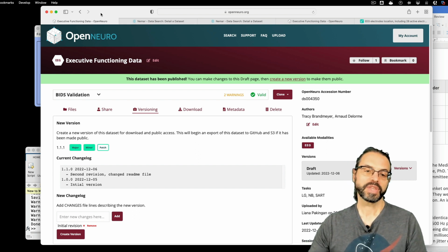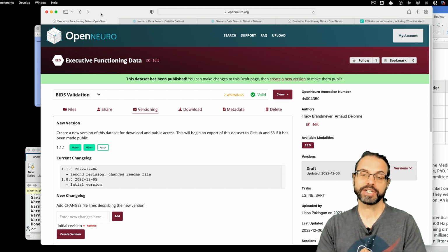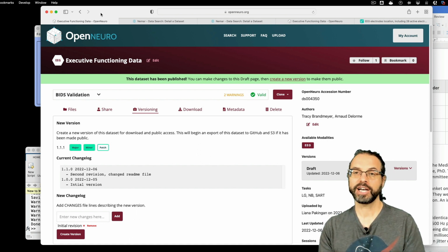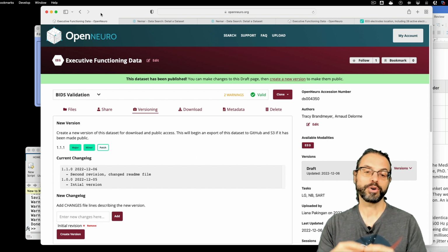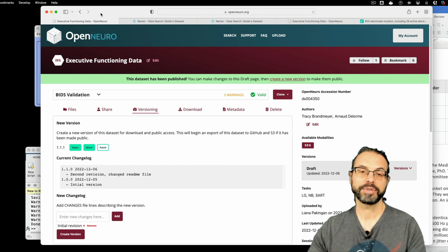So you can do it like this, and it's going to take you just a couple of minutes to export your data. But of course, that's not the recommended method. Even if you have a very detailed description in the paper of all the events, it's actually better to define the metadata in BIDS. And I'll show you that it's not that complicated.